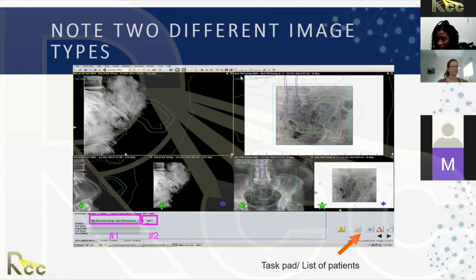Here's an MV setup DRR, an anterior field. Similarly, you can look at the bone structure here. Here's the DRR, here's the treatment field, here's what was actually treated for that particular day. And you can see, am I in a similar position? Here, I'm looking at the pelvic brim right there, and I see that, yep, that's exactly where I want to be.